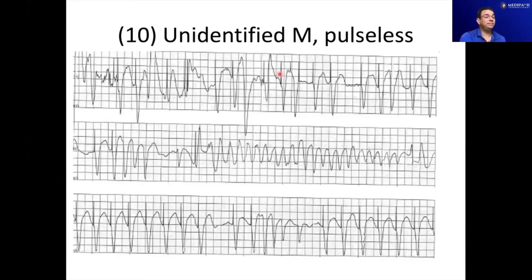Okay, here's a patient with tachycardia. It's fast. As you can see, it's irregular because it changes. And this is something called Torsades de Pointes, which is an irregular fast ventricular tachycardia. Torsades de Pointes means twisting of the points. And what you usually see is a narrower to wider change in the QRS with irregularity. And this is a classic pattern right here in this small section.